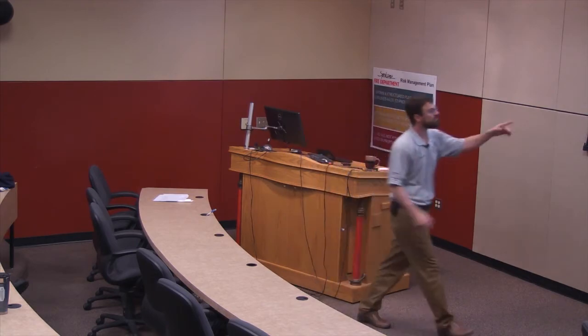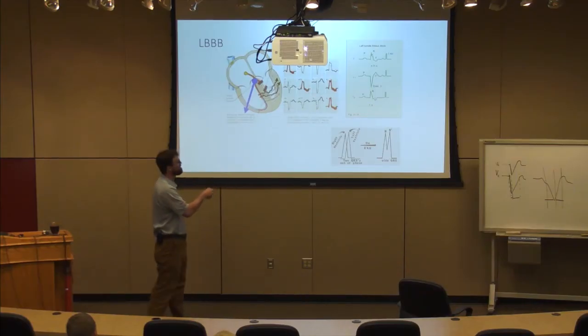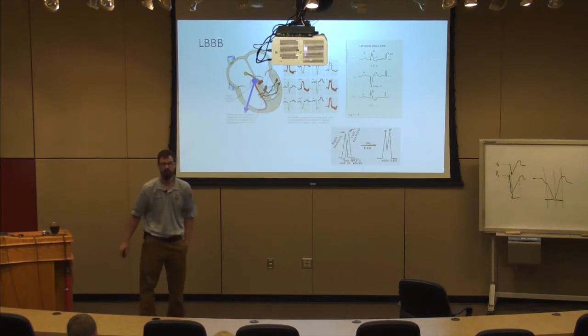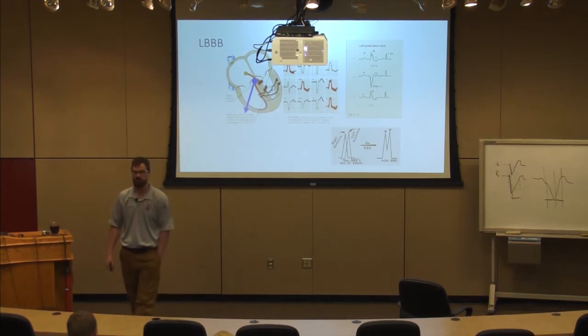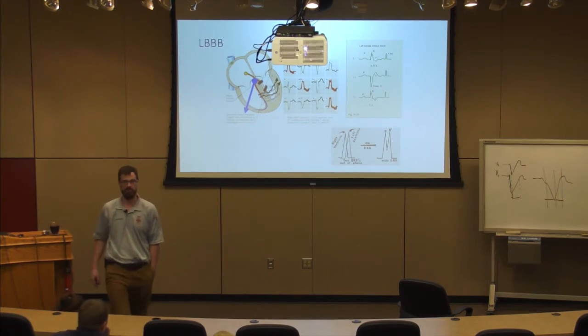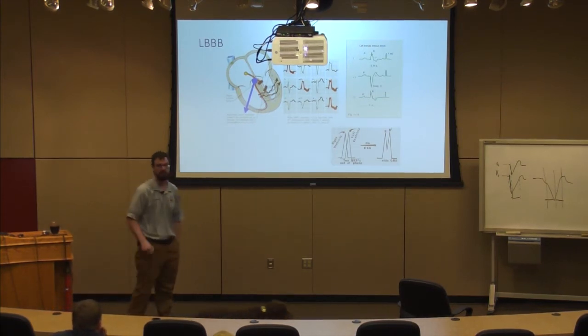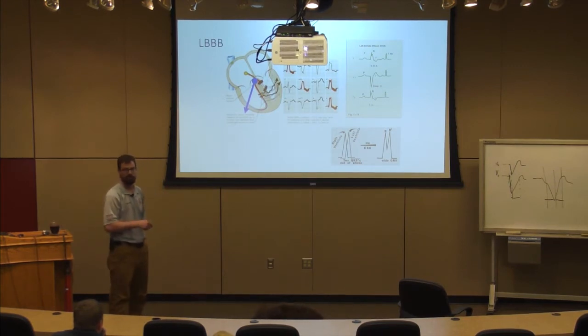So we look at these precordial leads for right bundle and left bundle. Big, wide, and down is my left bundle obvious sign. I look over at V6 for my supporting sign, and I can sometimes see rabbit ears, but more importantly, I never have a Q wave in V6 with a left bundle branch block. You don't get a Q wave, okay? So absence of a Q wave with a downsloping big R wave in the precordial leads.